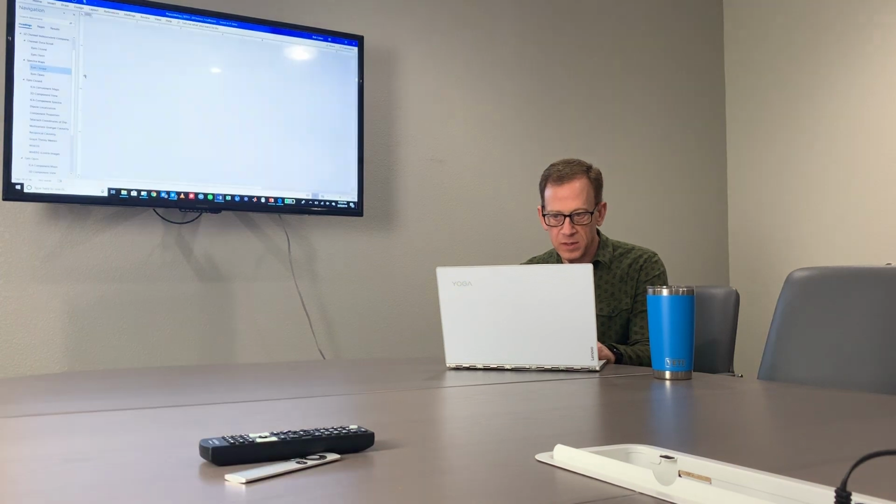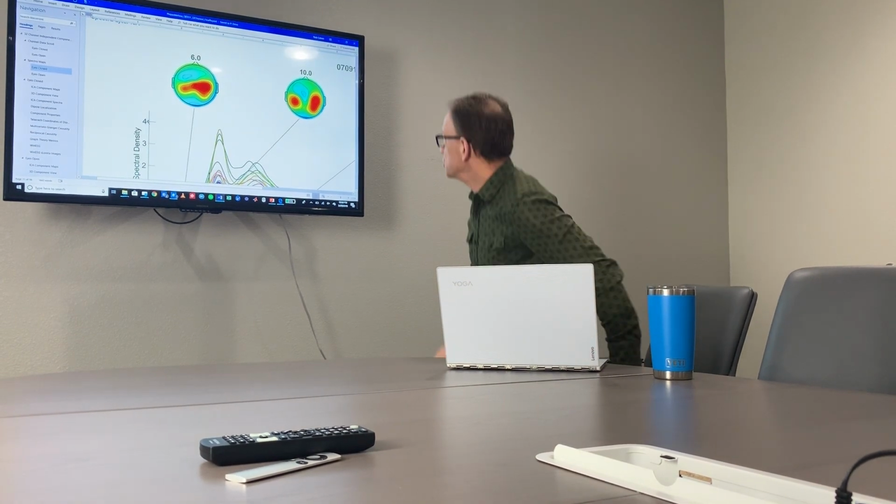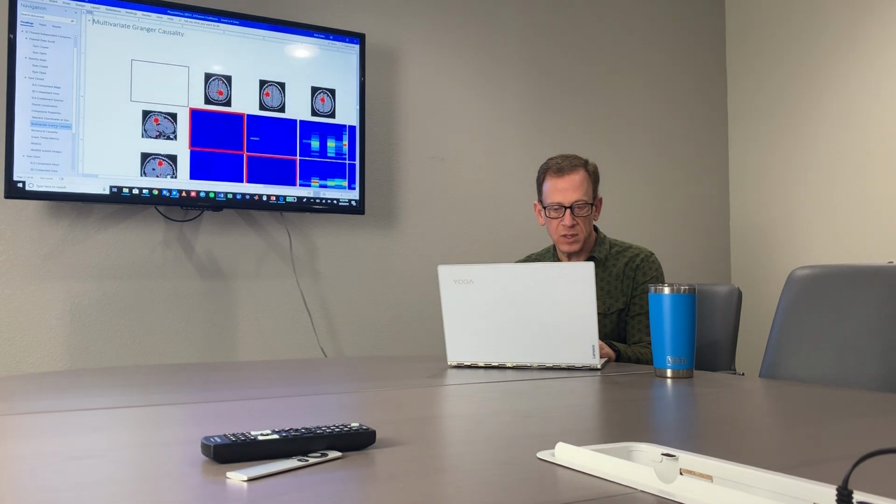And if you go back up to here, you'll remember we saw the majority of this excess activity over that right side of the brain as well. So the idea is that the connectivity imbalance is causing the brain to fire in ways it shouldn't. And that causes excesses of what we typically call power or amplitude or the waves of the EEG activity. And that's what leads to their symptoms.